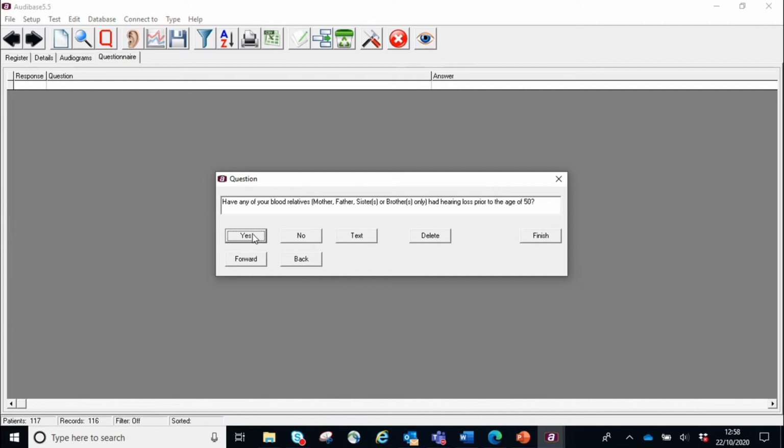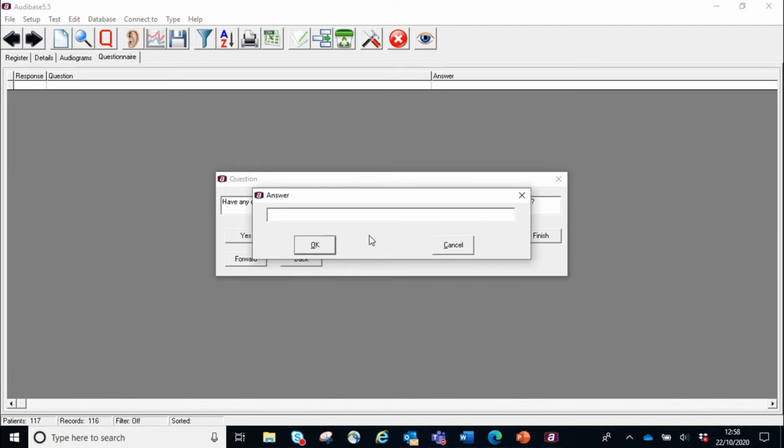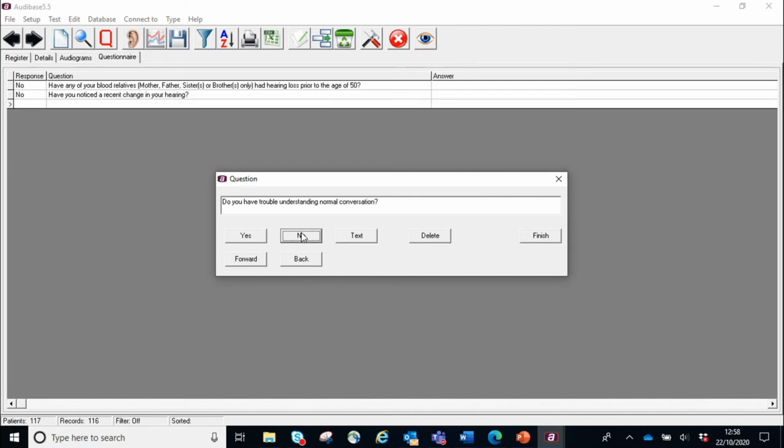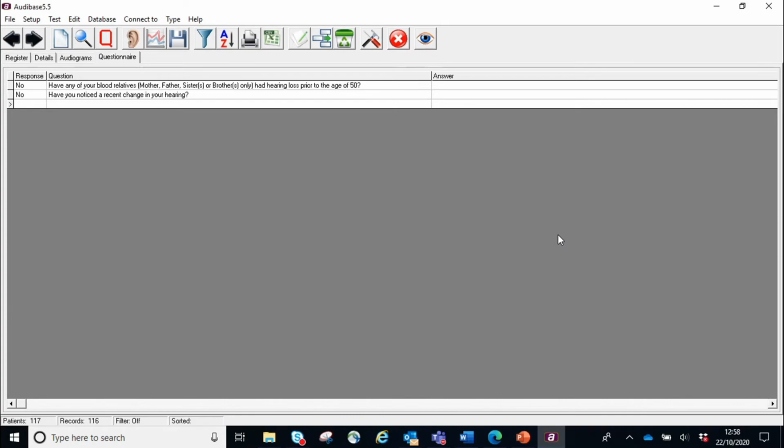And I would either answer yes or no to the question, or I can put in some text. And I would just go on to the next question until I'd completed them all, and then I'd click finish.